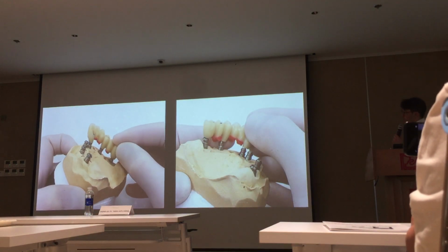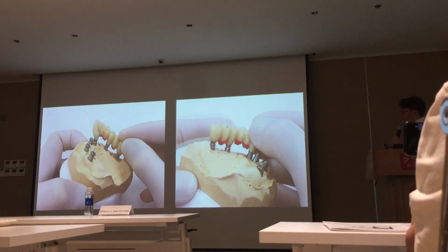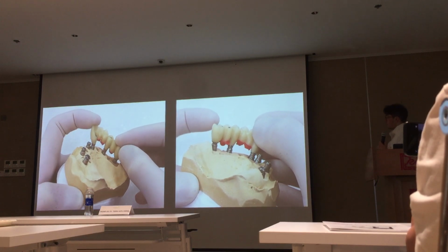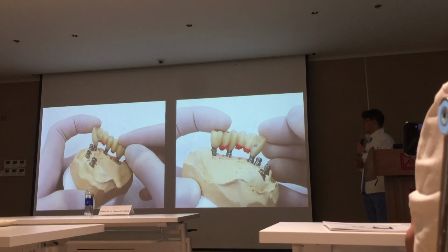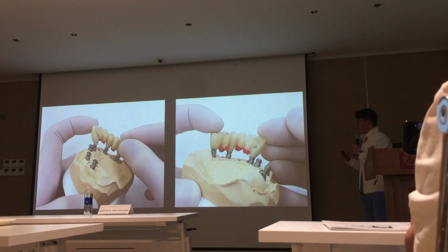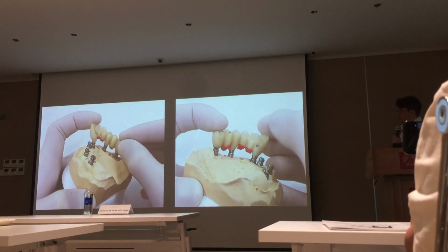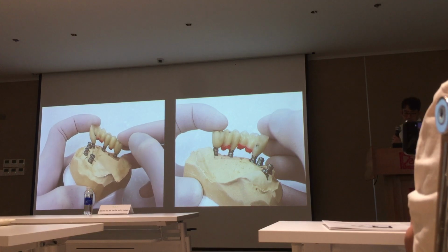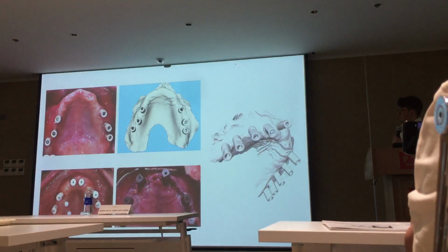Look at the fitness of the zirconia. It's very precise. You can achieve the passive fit. So if you can do the intraoral scanning very precisely, then the accuracy and fitness is very good.